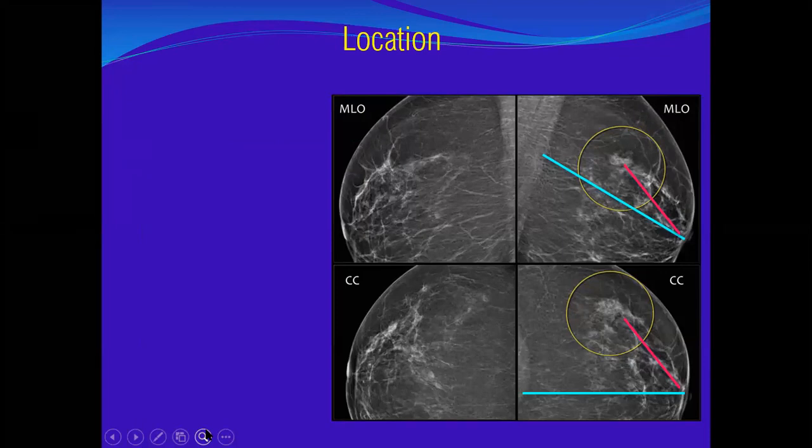This is the left breast. This is also in the upper outer quadrant. This is on the left side, either 1 o'clock or 2 o'clock. Why did you say either 2 o'clock or 1 o'clock? No, this is 1 o'clock, Dr. Rabab. Why did you say 1 o'clock?